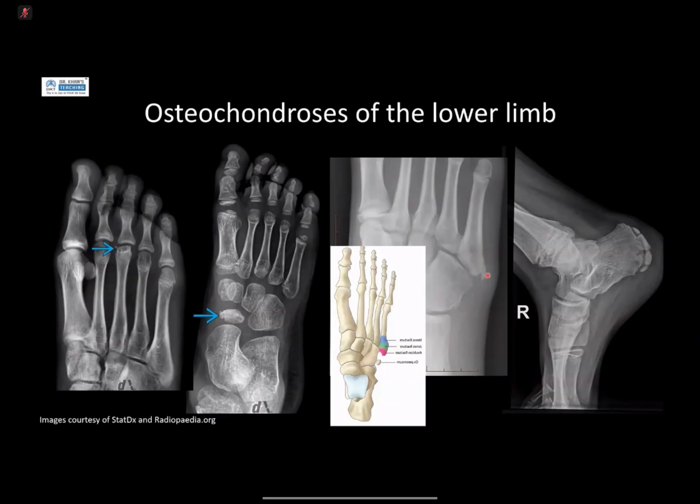So this one's a hard one, and things to look out for are whether you've got soft tissue swelling, and whether the patient's asymptomatic, because this could also be a normal apophysis site. Don't confuse that. Apophyses are always vertical, fractures are transverse, lucencies are transverse, and you've got stress fracture, Jones fracture, but essentially if there's a fracture, then you call it a transverse lucency. And of course, you get Sever's disease, which is fragmentation and sclerosis of the calcaneal apophysis.